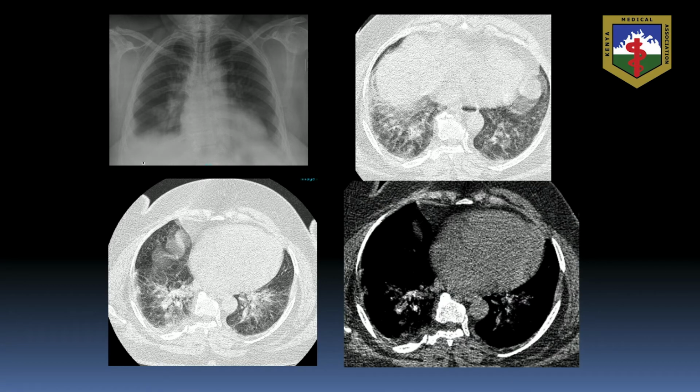On the extreme right, the bottom right corner, you can actually see that that is a mediastinal window, and you can see how not as helpful it is in the evaluation of the disease. Remember, in COVID-19, you have very minimal mediastinal involvement unless you're having cardiac involvement, where CT then would not be your option. So this was follow-up of a patient who had a chest X-ray done, and then the CT done for scoring and also for management.